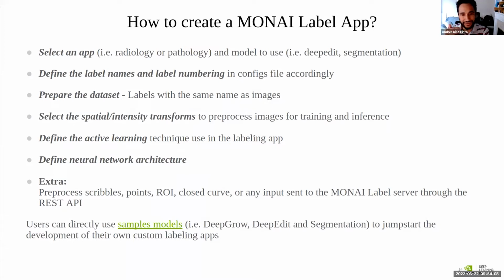So you need to define the labels. You need to put names to those labels and assign a number, right? So say 1, 2, 3, label 1, label 2, label 3. That's the first step, and you can modify that in the source code, right? So how many labels am I working with? Say 2, 3, 4, 5. That's the first thing.